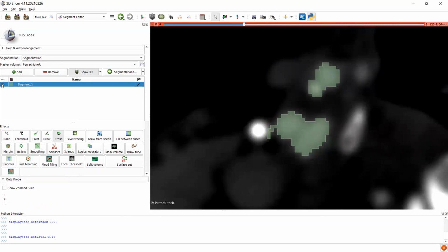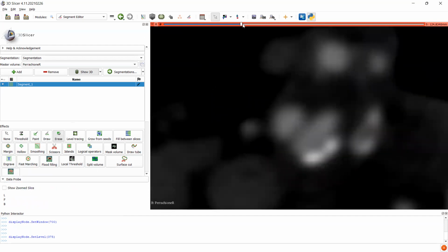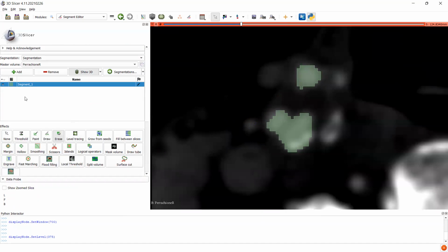That's fine. That's fine. That's fine. You see Slicer overestimating the flow lumen again.